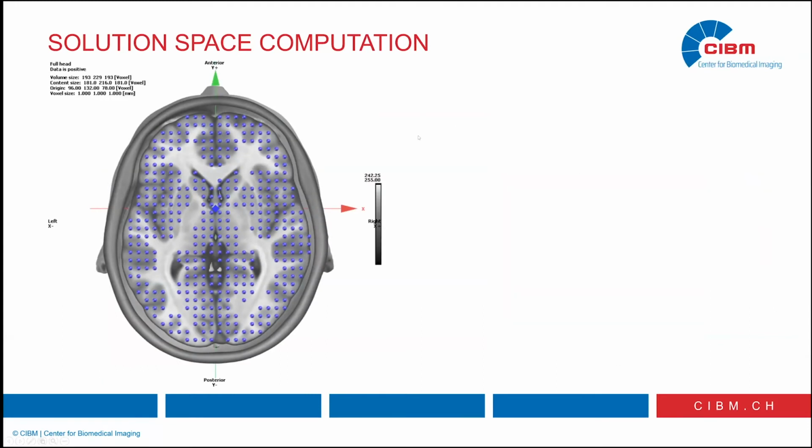What you want at the end is this. I think it's better for the inverse solution. You can see that the left and right points are very well balanced when you see right around the mid-sagittal plane. And globally, left and right balance is quite okay. Also, the MRI is asymmetrical here. It's an asymmetrical template. So if, for example, there are more points on this left part, that's because that's the anatomy.